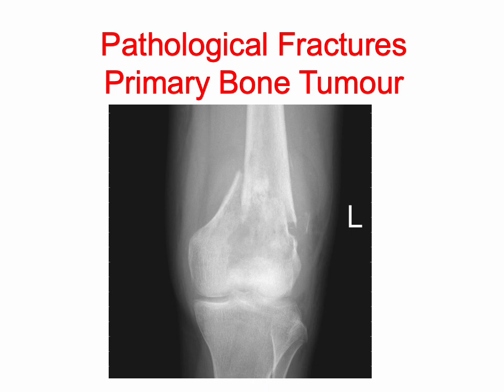Unlike the bone cyst that we saw before, it's harder to draw a real line around this area of lucency in the distal femur, and you also have an aggressive type of periosteal reaction in that there's a Codman's triangle here. A Codman's triangle is a type of periosteal reaction where the periosteum doesn't have time to ossify as it's being laid down, meaning that there's very rapid growth. There's also this soft tissue component to it here as well. So this is an aggressive bone lesion, and like I said, osteosarcoma.